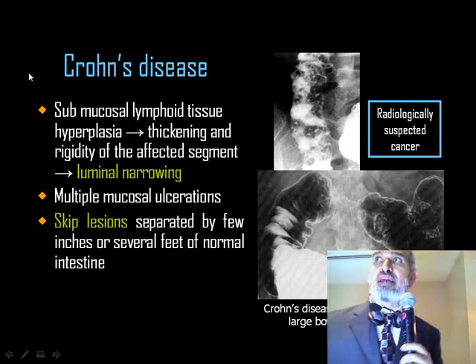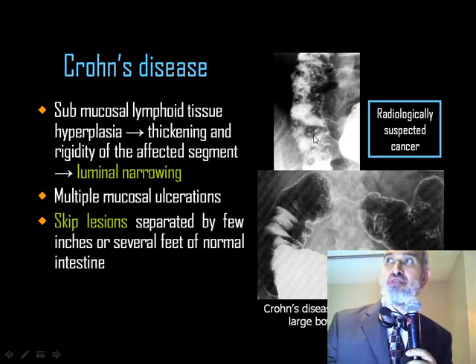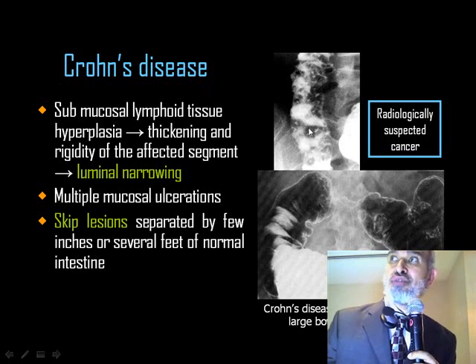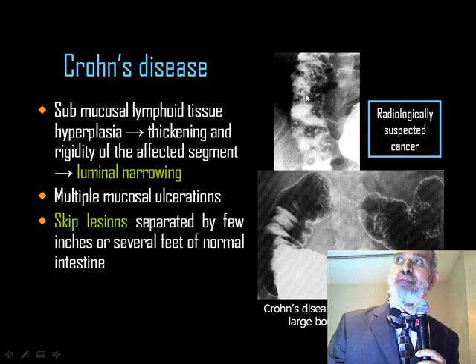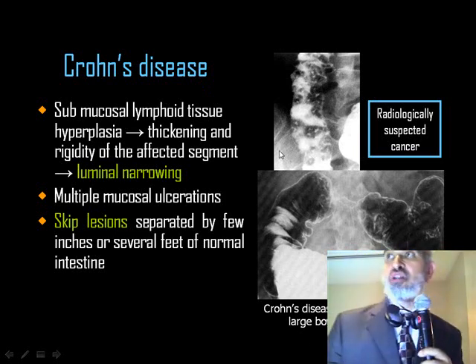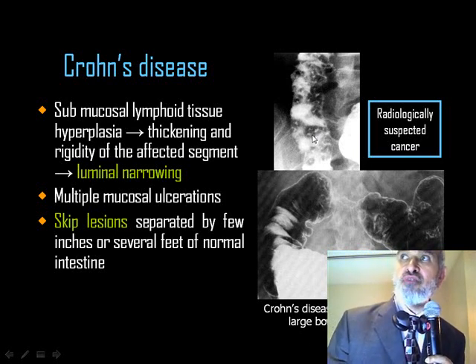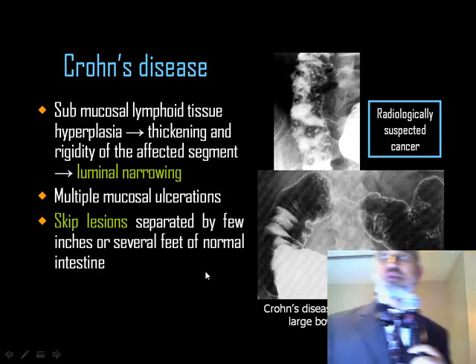Then Crohn's disease in the colon may result in a typical appearance which is known as aphthoid ulcer. Aphthoid ulcer is a small ulcer surrounded by a halo of edema, and you can see here many ulcerations in this segment, each ulcer having the typical criteria: an ulcer crater filled with barium surrounded by mucosal edema, and this halo of radiolucency represents mucosal edema.